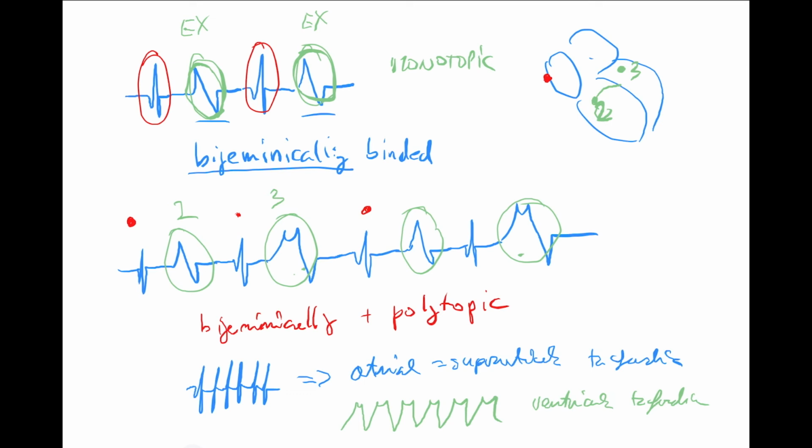Because remember, supraventricular tachycardias, yeah, well, they could go fast, but it's sort of, the contraction of ventricles is okay. And they don't go so fast. So yeah, it's not so good, but if we compare it to V-tach, they're not dangerous. But V-tachs, those are so dangerous. Okay, of course it's always up to the speed. I mean, if you have an atrial tachycardia that goes 250, yeah, it's dangerous, of course, because the ventricles will have no time to fill. But this is not so common. But V-tachs, they can be really like 250 very easily.